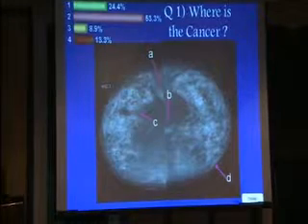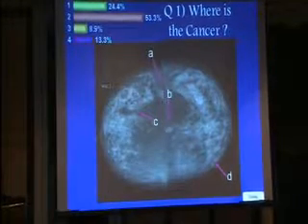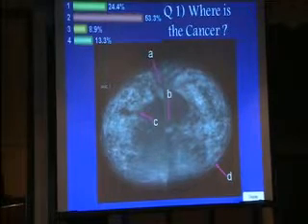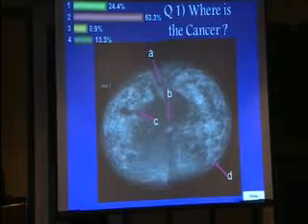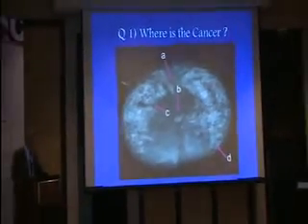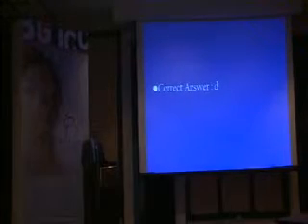just an asymmetry without any further details. But let's go and see what is the correct answer. Unfortunately, the correct answer is D. So let's go back again and see what did we miss.